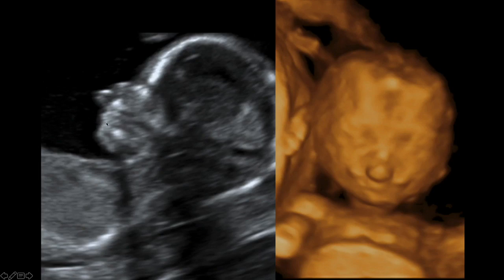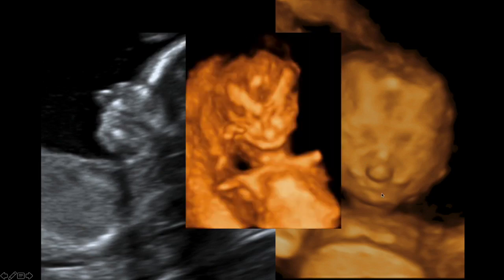This is the complete bilateral cleft lip and palate, which is why it was so easy to spot, because it forms that protuberance or that beak. And then in 3D, you can see that there is a seam here and on here, which means that the inner maxillary segment and nose are sort of free, and the cleft is on both sides. And then if you move in with your slices, you can actually identify the actual cleft in the actual palate a little further in, where you can see where the palate actually divides on both sides.